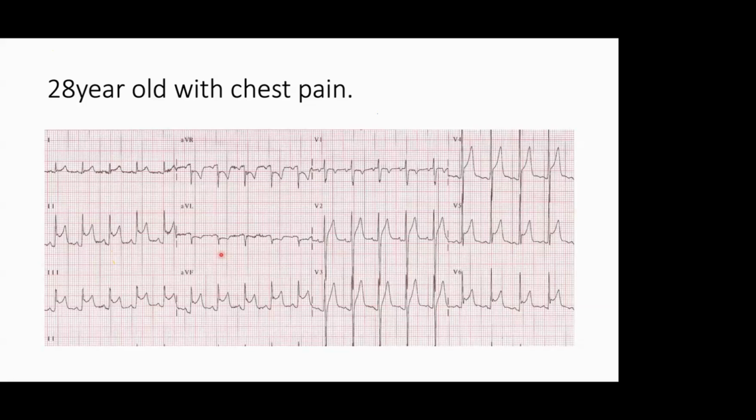Okay. So you have to see all the 5 points, usually in anterior leads mainly, and in other leads also. You have to see the loss of R wave height. If you just remember those 5 points, you can confidently tell it's not a myocardial infarction. Of course, you have to see the patient and the biomarkers also. But the ECG will give you confidence to treat the patient with some anti-inflammatory.